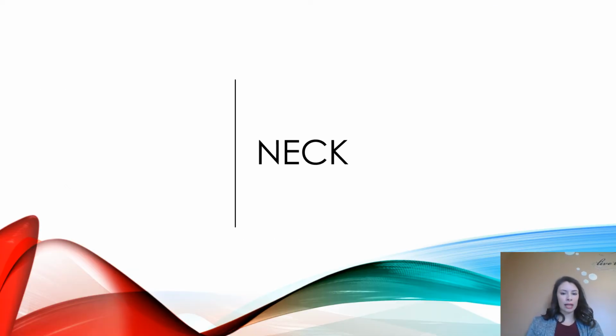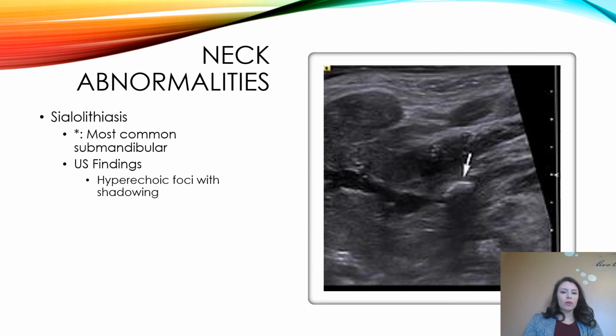Moving on to the neck. So the first neck abnormality is sialolithiasis, and this is the most common in the submandibular gland. The ultrasound findings are hyperechoic foci with shadowing, and you can see this foci right here within the neck.